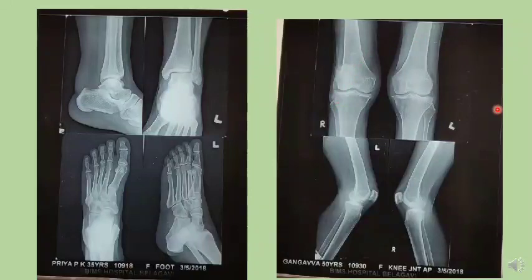Come to this radiograph. This is plain radiograph in the upper part. I'm speaking now here. Plain radiograph of right and left knee joint, showing lower part of the femur, upper part of tibia and fibula, knee joint, as well as this is the shadow. Can you make out? This is the shadow of patella, making dense shadow. Here this is left patella. Both right and left knee joints are exposed. AP view, in AP view.